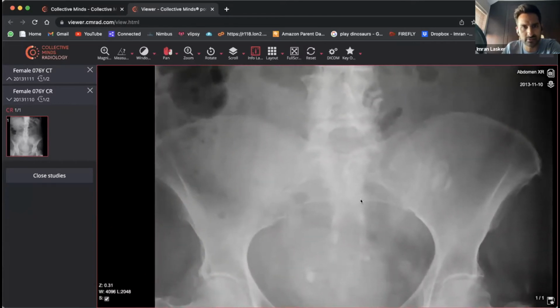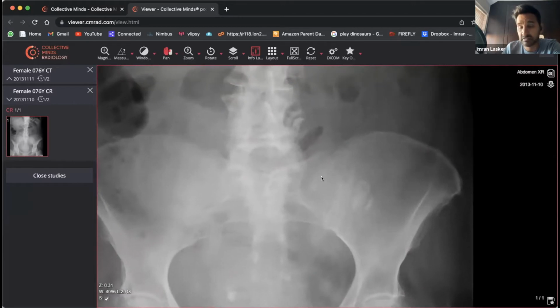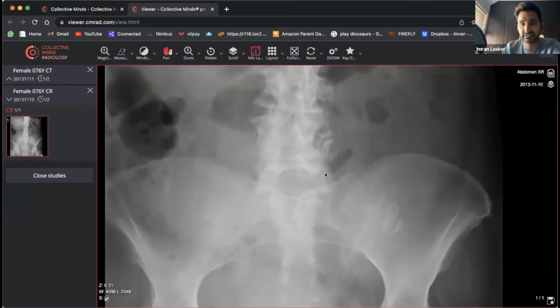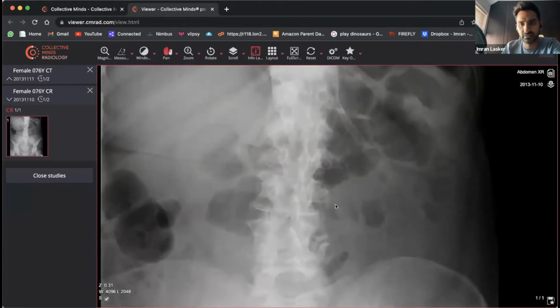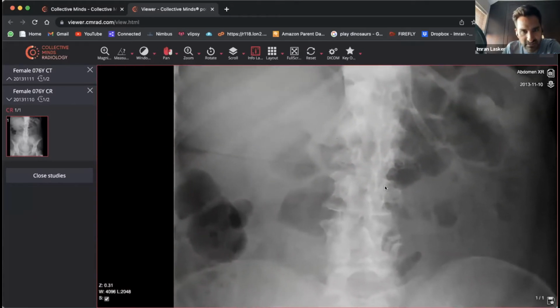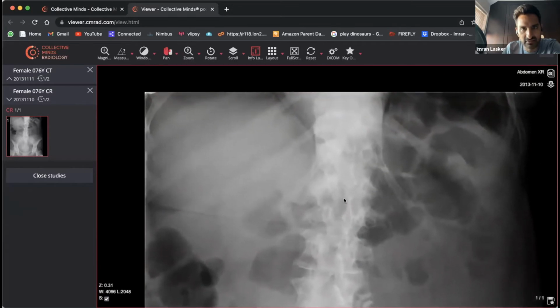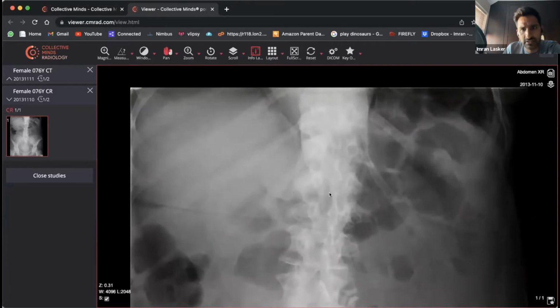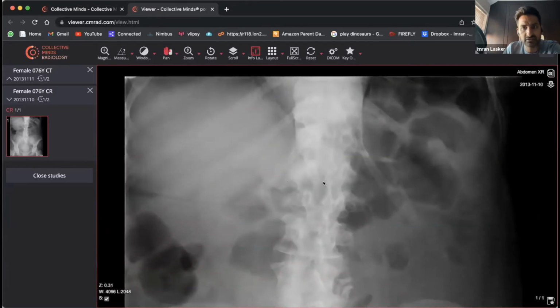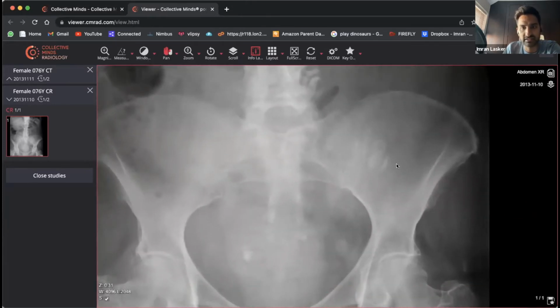Could it be something to do with the hip? Maybe it could be some slightly hyperdense fecal material sitting within there. I guess you'd have the descending colon sitting along that region there. Can't really convincingly say that I see any evidence of any bowel dilatation anywhere. And the liver and everything else looks okay. So the only thing that we can really say at this point, for definite, is these almost spherical lesions that are sitting over here.